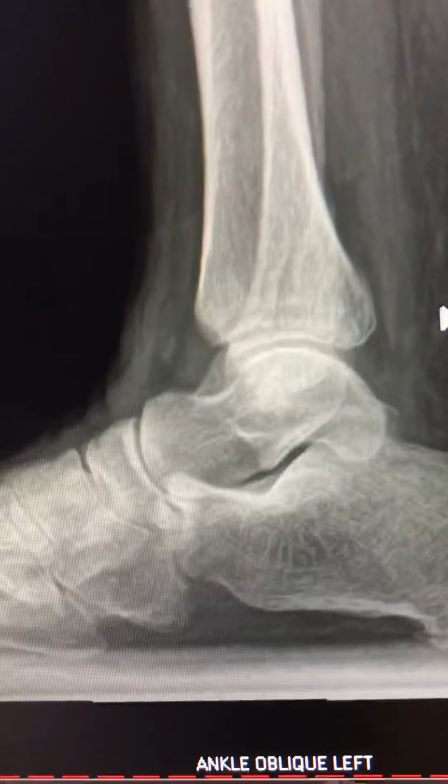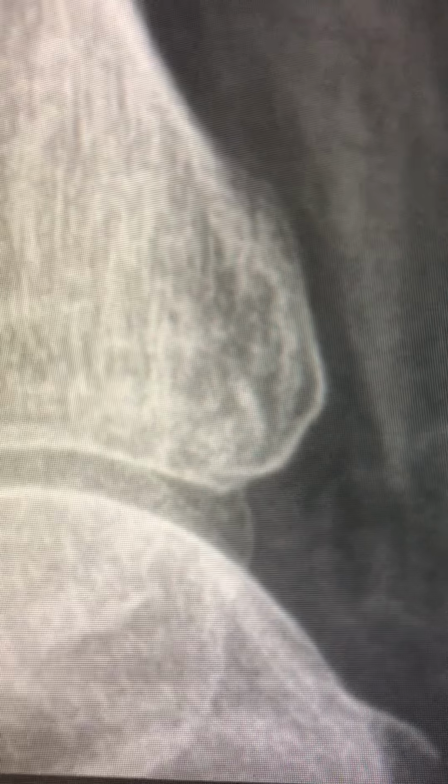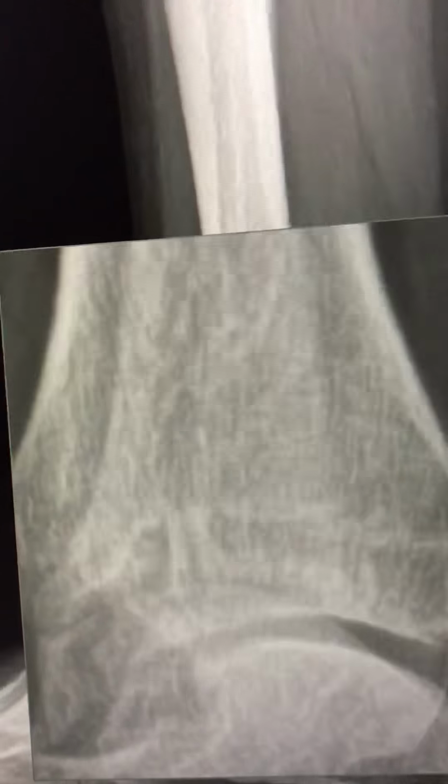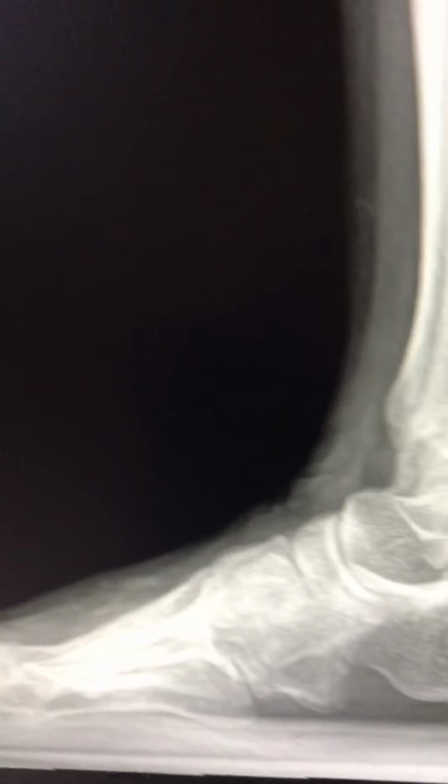That's very good. And we can see the back part of this tibia, the posterior malleolus, we call it, where you can barely see the crack on top. And what else is there? So the alignment is there. Not much going on. The length is fine. Let's see what we've got.